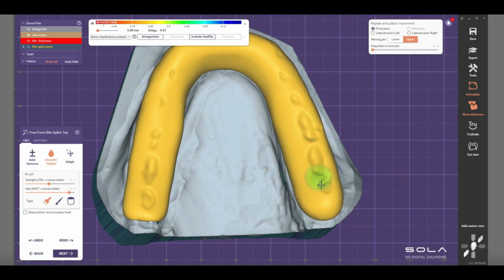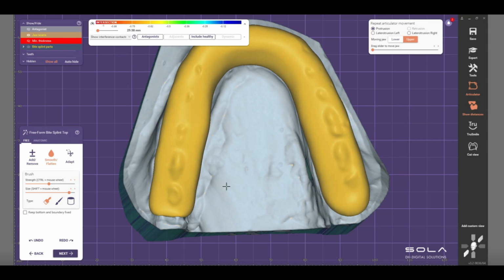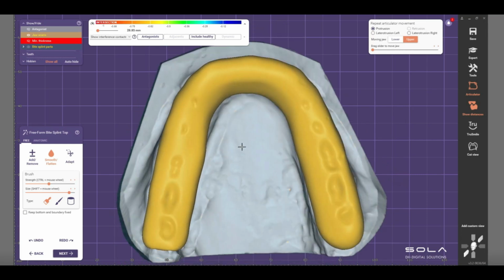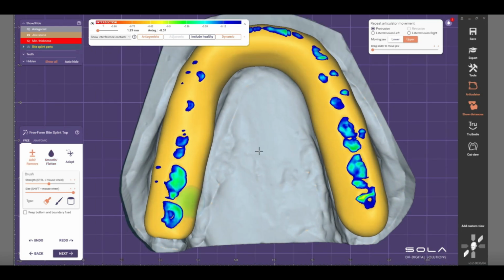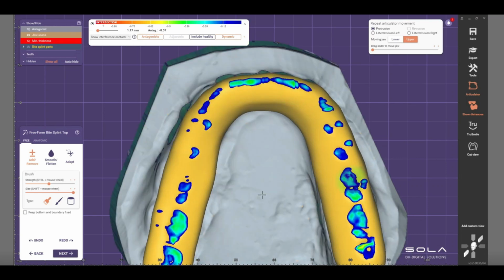Now some of the clinics, the doctors do not want smoothing. They need real plain. They don't need indentations. In that case, you can smooth with a flat, with a shift. You can smooth with a shift, but make sure the contacts are there. You can do that too. But again, depending on the lab's requirement, if you click on the antagonist again, that comes back again. So we do have the contacts. I do still have the contacts. I'll add a little bit slightly over there to make sure.